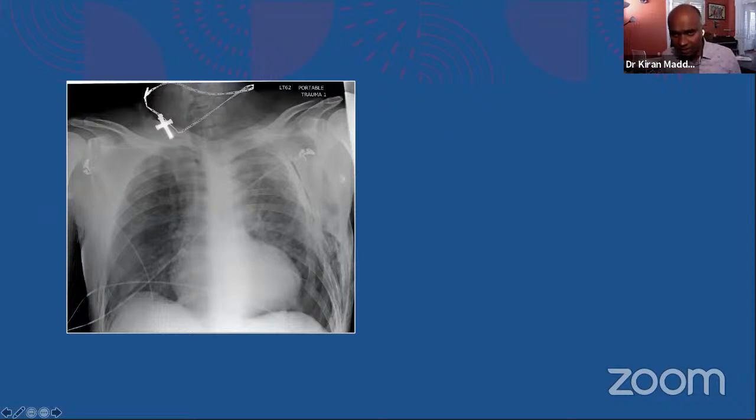Anybody wants to take the case? This is taught in every final year surgery textbook. The clue I can give you is the patient is having paradoxical breathing.